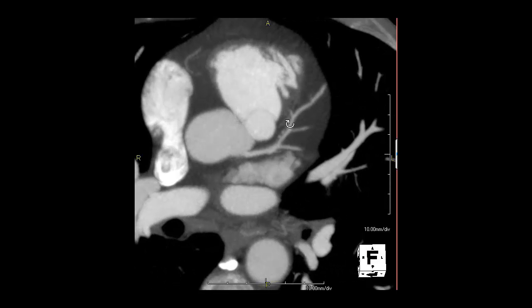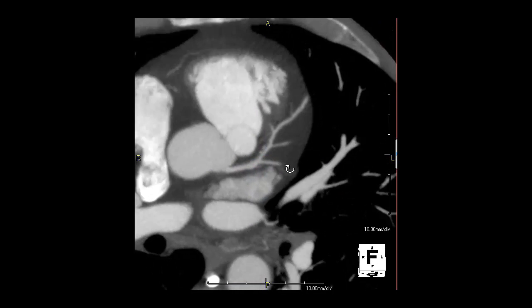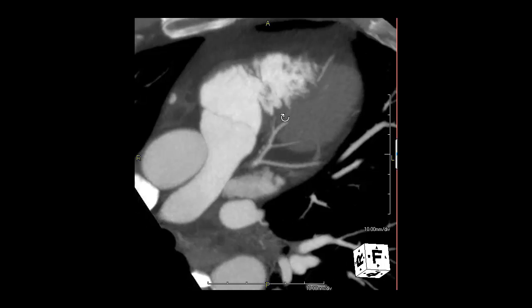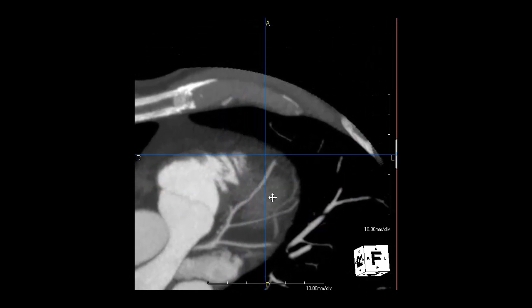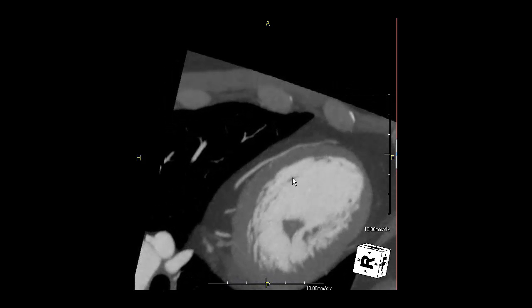If we examine the left anterior descending, we see that the proximal segment demonstrates some extraluminal material that appears to be on the order of the same density as the contrast media. This raises the possibility of an ulcerated or dissected plaque in the region. However, the lumen does not appear to be compromised. So this is moderate eccentric plaque consistent with ulceration or dissection. The remainder of the left anterior descending artery appears to be basically normal all the way down through the apex.